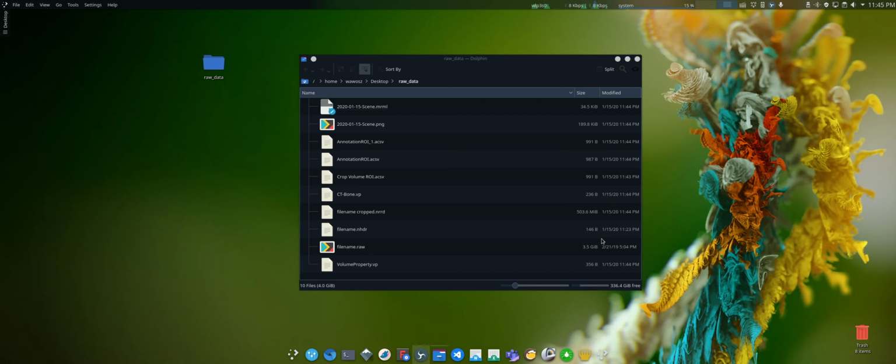All right, so that concludes the method for cropping the data sets. And in the next, the final step, we'll perform some type of analysis.